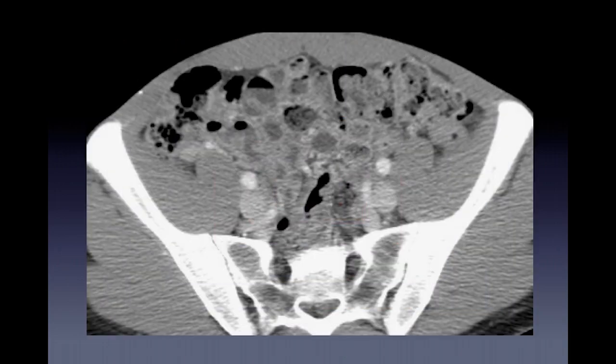Now, when radiologists went back and reviewed those studies, the 2% of patients where they missed appendicitis because they could not find the appendix were usually patients that looked like this, where there's a real lack of intra-abdominal fat, and there are many bowel loops crowded in the pelvis. And in retrospect, the radiologists weren't at all surprised that they had missed an appendicitis in those cases. This accounts for most of that 2%.